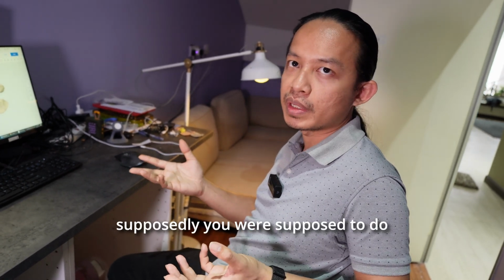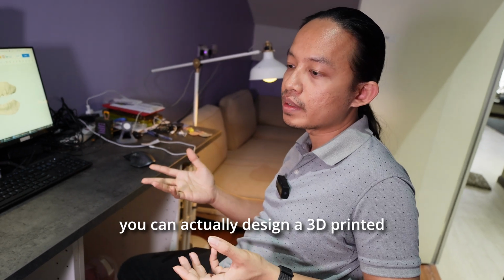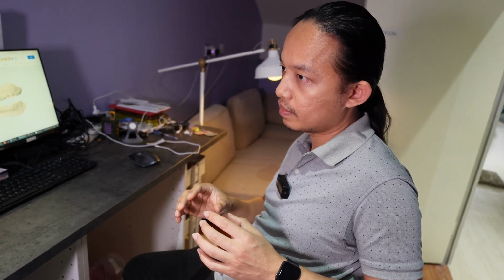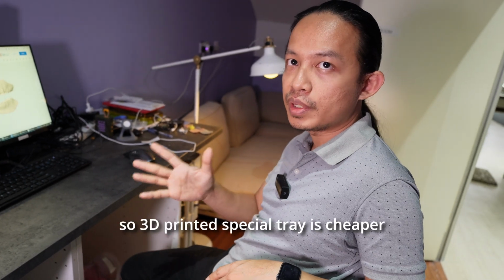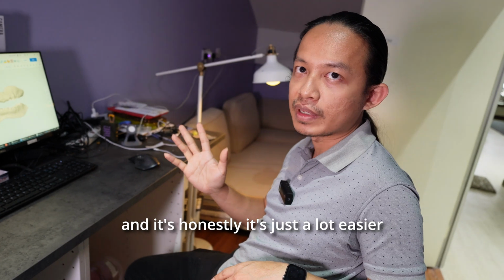Supposedly you were supposed to do a secondary impression. You can actually design a 3D printed special tray, and you don't need to use light cured acrylic to make the special tray anymore. It's a lot cheaper really. So a 3D printed special tray is cheaper than using the resin, and honestly it's just a lot easier.